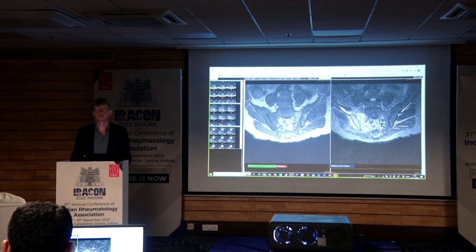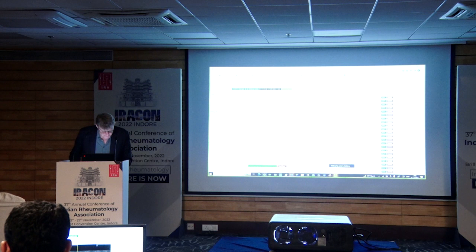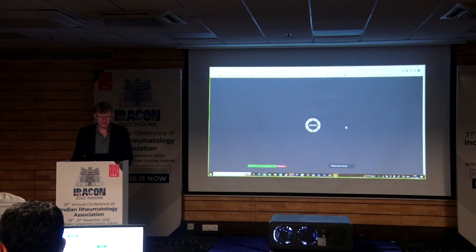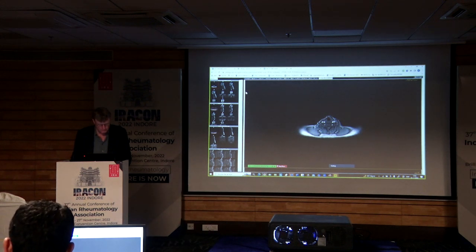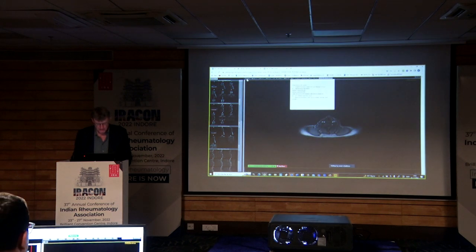Right, then, unless there are questions, this is important to remember, how that looks. And it can be more subtle, of course, but it's a typical presentation. The last case we will make regarding this is B2. B2's SIJ case B2. And again, the usual procedure: T1 and STIR on right and left.